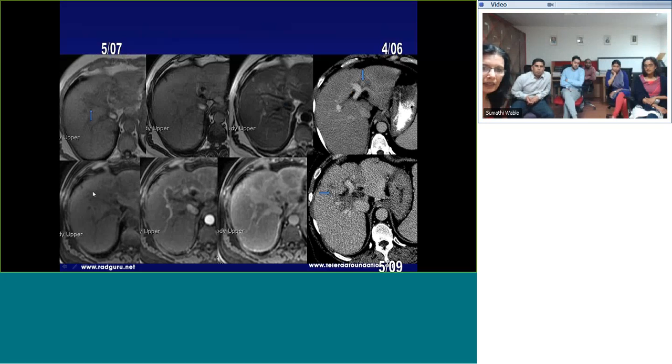post-contrast images? Post-contrast images, again, kind of low on T1, which was seen already, and immediate post-contrast, again, hard to say, not much of an enhancement, but it retains contrast on the delayed images. It's kind of the opposite of what you want to see in HCC. And this is how it was on the subsequent CT scan. As you can see, it really didn't do anything to the vessels. Normal vessels didn't move anywhere.